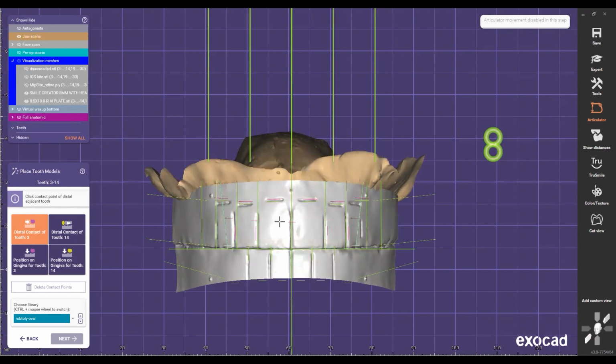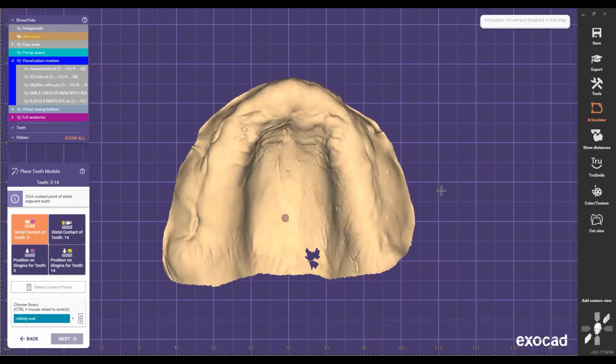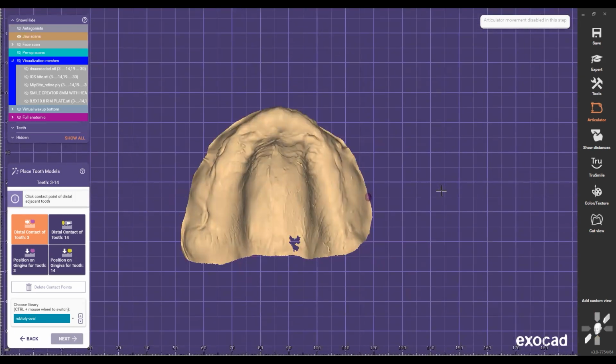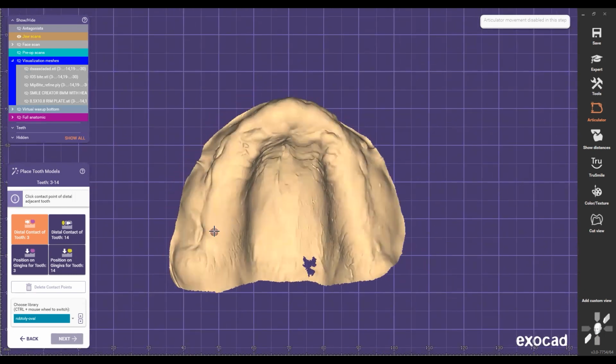But if I don't have this, it doesn't make sense for the software to give me teeth. If I don't have the proper orientation on my models, I don't have the proper incisors, I don't have anything. So all I'm doing is putting teeth there. That's why when I see posts on social media without guidelines, without facial scans, I wish I could share what I know, so they can start seeing this from a different perspective. That's why we're doing this webinar, so you can see how Instaris is doing these cases. I hope this will help you get these cases done properly.